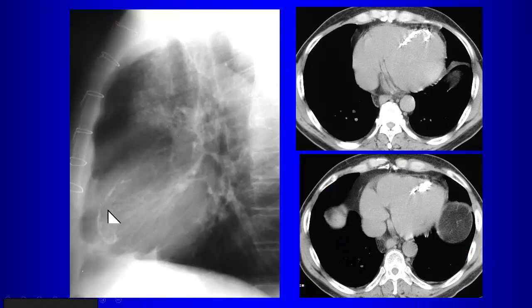And most patients have right coronary artery dominance, as that favors longer survival after LAD obstruction. So here's another example of myocardial calcification, better seen on the lateral view. In this case, though, you can see most of it is along the interventricular septum. But again, that's in the course of the left anterior descending coronary artery distribution.